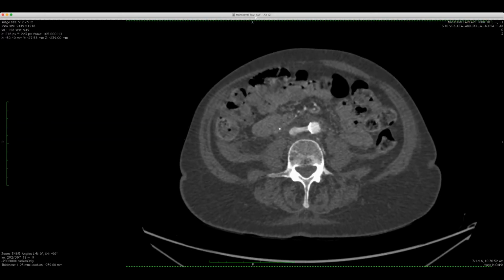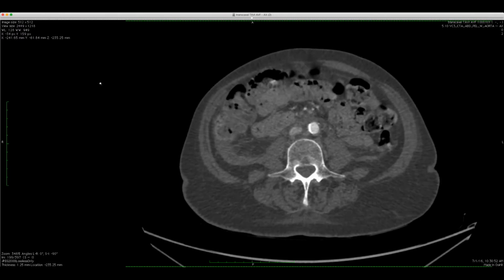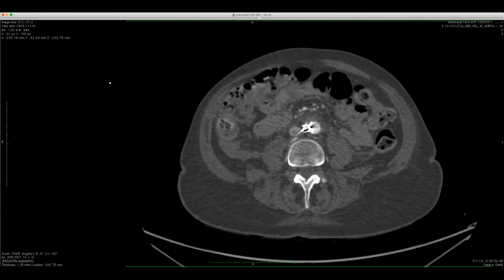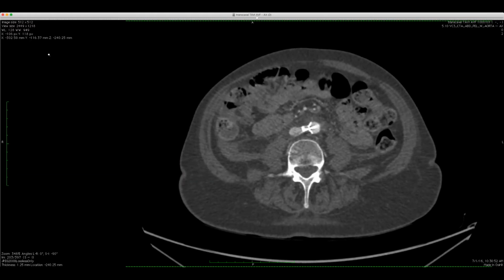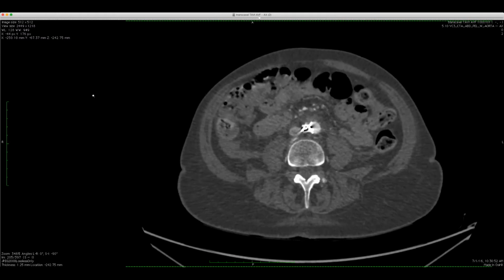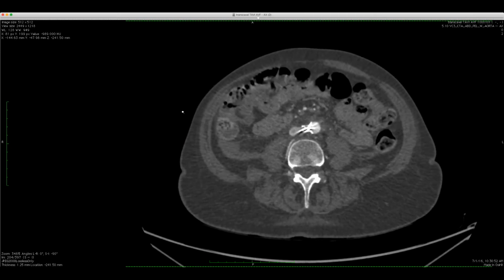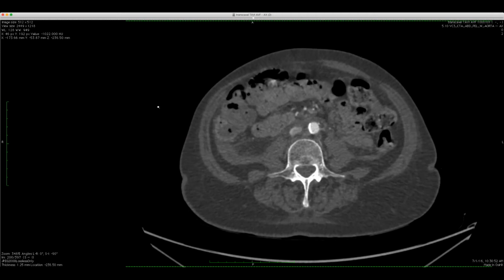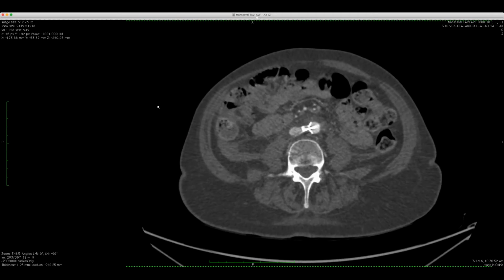And this one was a recent case, so I'm not sure what they're going to do with this. But have you all been seeing many of these? We don't see a lot of these persistent fistulas. If we can't go the transfemoral route, they tend to go in with a mini thoracotomy here, just go right to the cardiac apex. Yeah, the surgeons here have done that. They've had a number, and they say they prefer that less because it's a more morbid procedure than this.